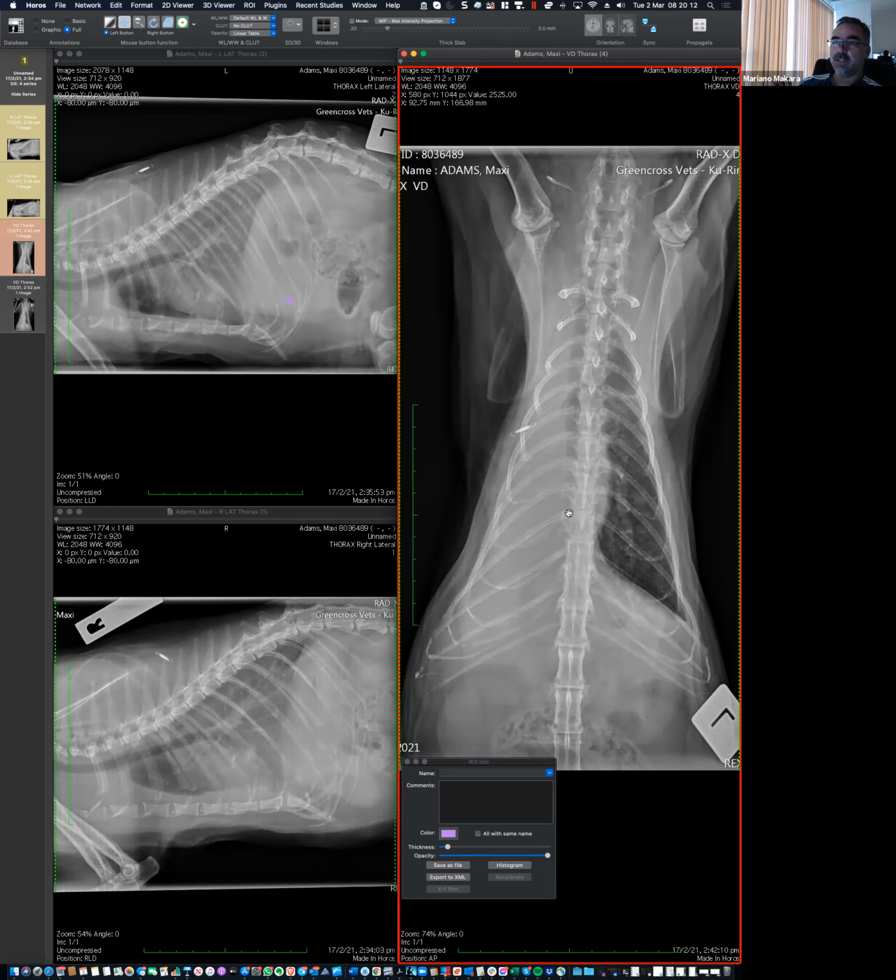Or at least there is a disease that is resulting in displacement of all the gas within the lung. And now we have soft tissue within that lung. And in that scenario, we can even have pleural effusion that will be silhouetting or no pleural effusion if everything that we see in there is lung.